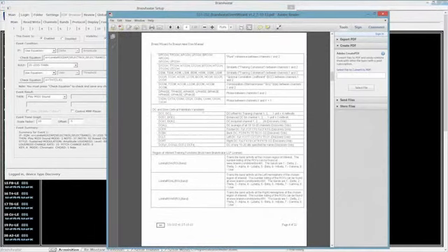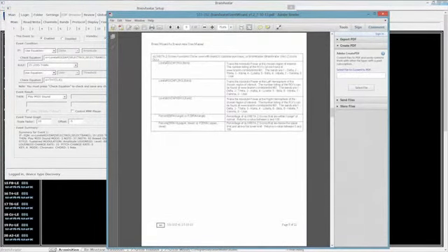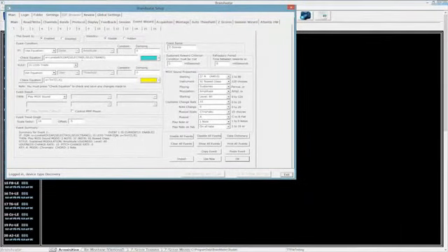Once again, we'll go back to our Event Wizard, or data dictionary, and look up the Loretta ROI ZAP ROI band, which means it trains the absolute power of the Z-score at the chosen region of interest. And of course, we've gone through all those little details right there, and we know we're using select ROI and select band.